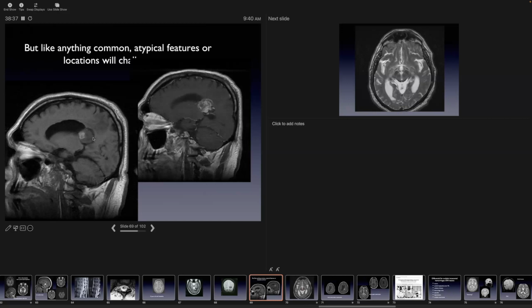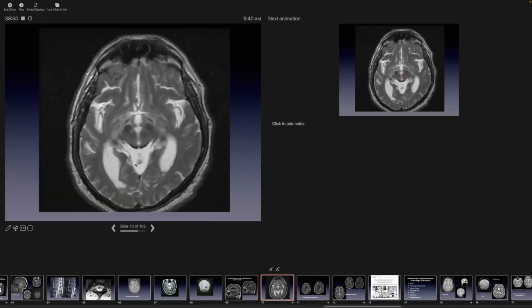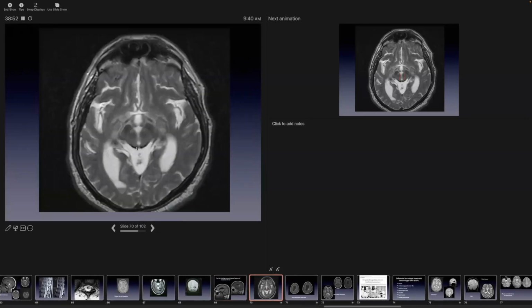This patient had what we thought was an intraventricular mass that enhanced quite a bit, but not homogeneously, and had a little bit of hemorrhage. I was happy to say our fellow at the time, Becky Benz, noticed this siderosis around the brain stem. This was an indication that this lesion had been hemorrhaging in the past.